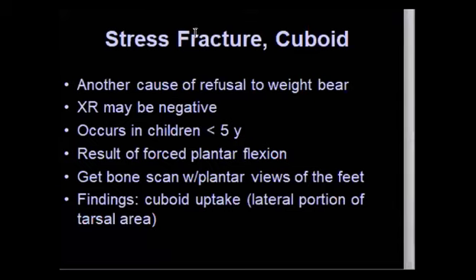If they give you a bone scan and there is increased uptake at the level of the tarsal bones on both sides, then we are talking about stress fracture. Stress fracture in the cuboid.